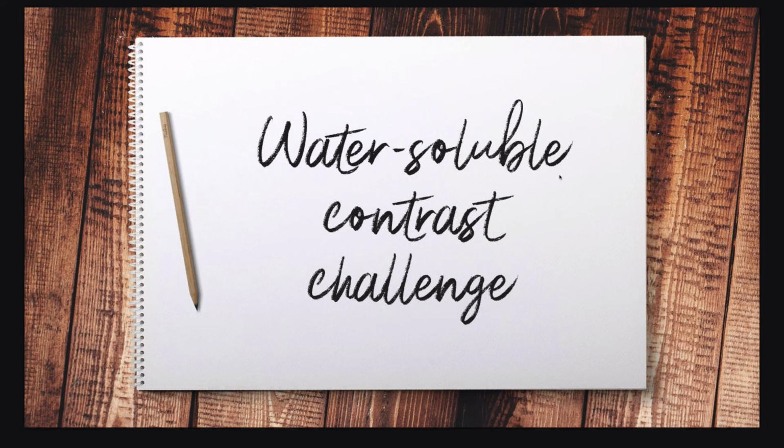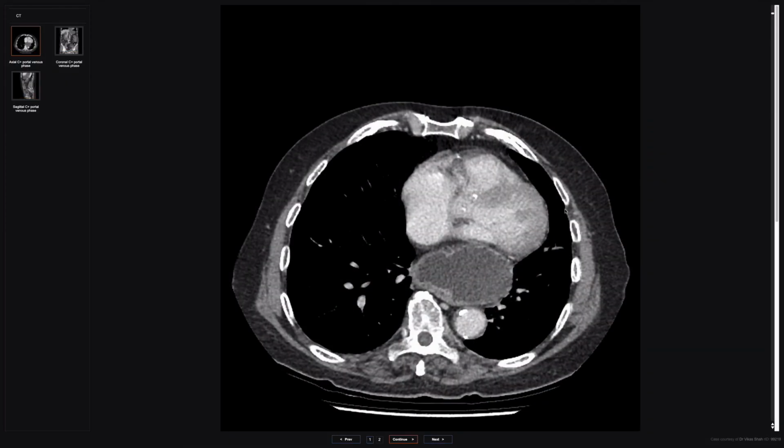Now there are two more important specific contexts where we use abdominal radiographs now, which I'm going to talk about. So the first is a water-soluble contrast challenge. Now, this is sometimes known as the gastrografin challenge. So this is both a therapeutic and diagnostic procedure done for non-complicated small bowel obstruction.